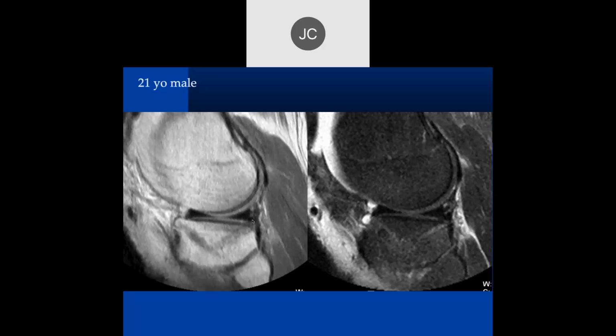The donor graft is not too large, in which case it flops over the edges, or too small, in which case there's a lot of peripheral bone here. So that's good. Now, what you'll often find is that there will be another black structure here with vertical increased signal intensity.